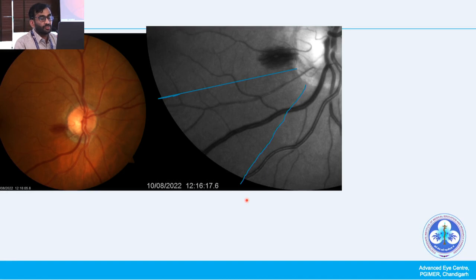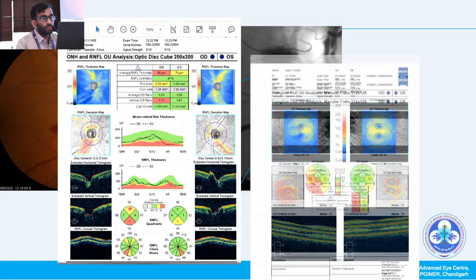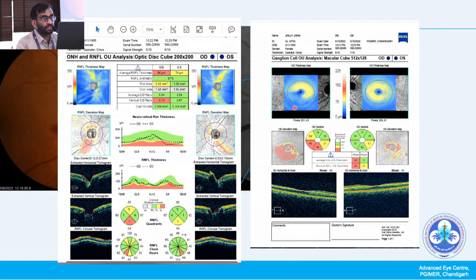Whereas in this patient, a 62-year-old female with primary angle closure disease, there is a disc hemorrhage inferiorly. If you see the contour of the cup, there is a notch, even touching the inferior margin. And the OCT shows global thinning inferiorly, along with the typical temporal changes, the temporal raphe sign, because this is a wider inferior area of loss, which also includes the inferior central fibers.